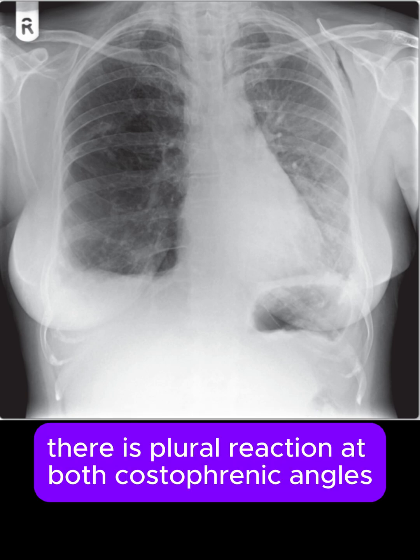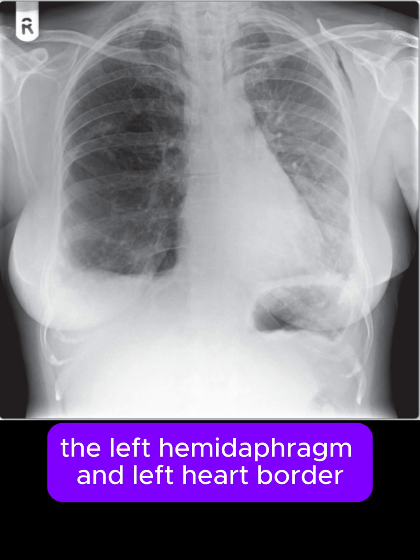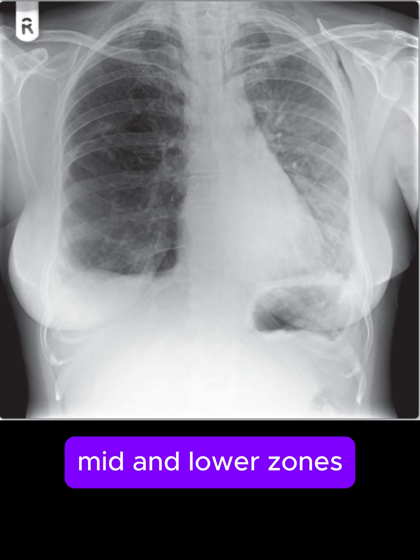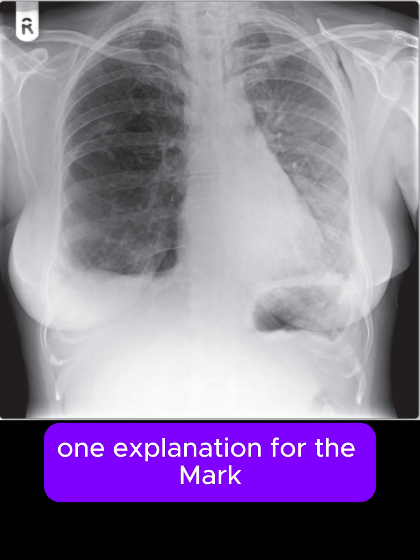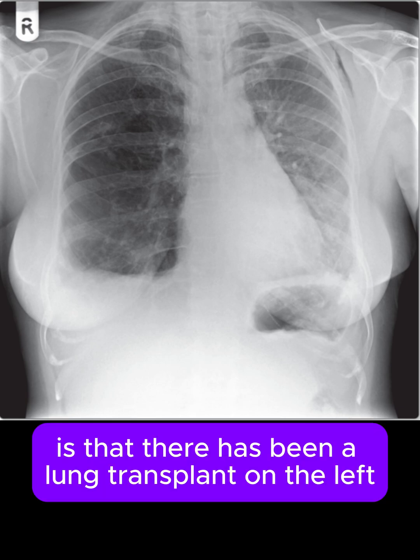There is pleural reaction at both costophrenic angles. The left hemidiaphragm and left heart border are clearly visualized, and increased density in the left mid and lower zones is more in keeping with effusion than collapse or consolidation. One explanation for the marked discrepancy in the appearances in the lungs is that there has been a lung transplant on the left.